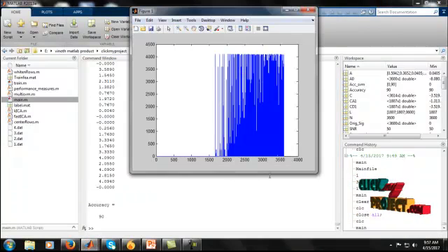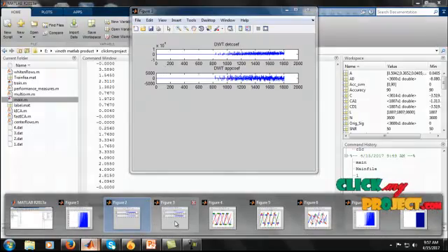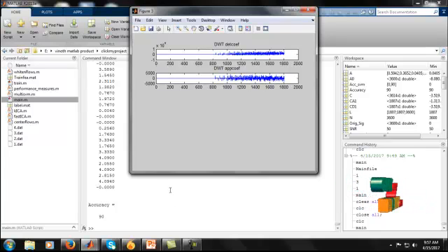Initially we take the input signal as an EEG signal, and next we have to apply the wavelet detail coefficients and wavelet approximate coefficients. So it is going to analyze the coefficient values of our input EEG signal. Next we apply the DWT detail coefficients and DWT approximate coefficients. DWT means discrete wavelet transform. It is going to analyze the noise and predict the noise to remove, before our inverse DWT ICA.